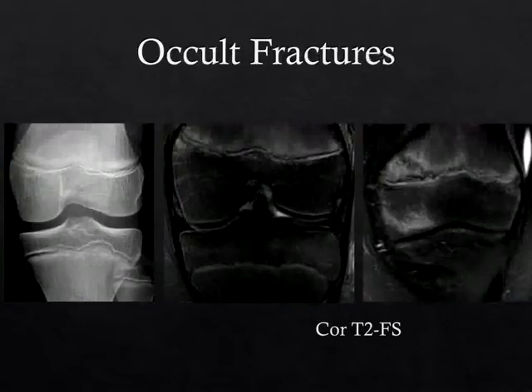So, on the left we have a radiograph of the left knee, which is essentially normal. If you look at the distal femoral physis on the MRI, you can see elevated T2 signal within it as compared with the proximal tibial physis, and then more medially at the distal femoral metaphysis, there's a hypointense fracture line. So this was a radiographically occult, non-displaced Salter-Harris 2 fracture.